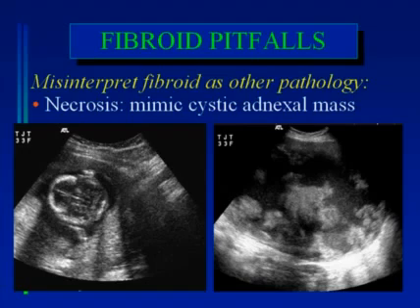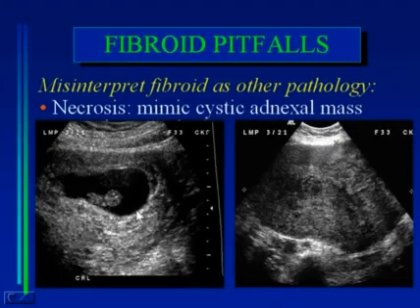However, fortunately, it turned out that there had been a prior study done on the patient during the first trimester of pregnancy. You can see the embryonic crown rump length here, and at that time the mass had an entirely different appearance. It was completely solid in appearance and had some areas of shadowing from it, and this mass was simply due to a fibroid that had infarcted and degenerated and become very necrotic.